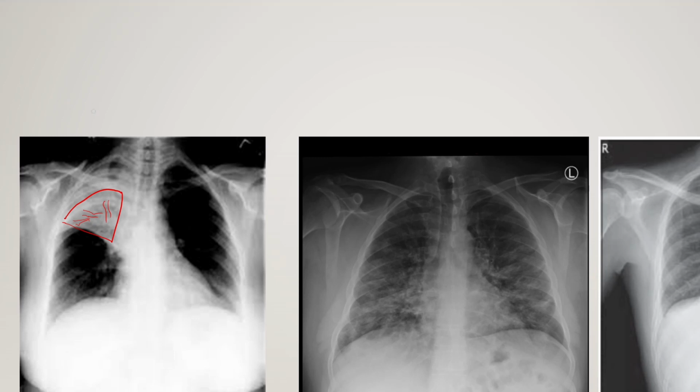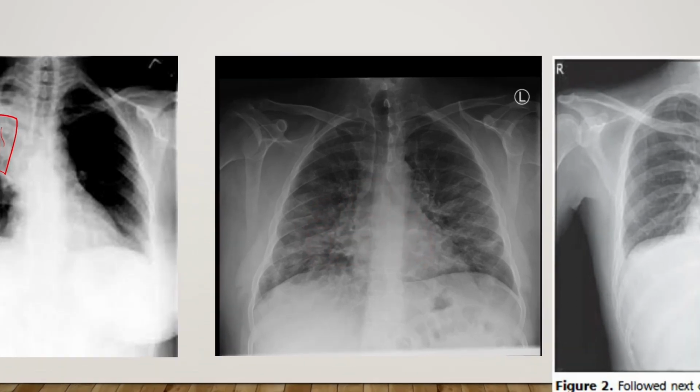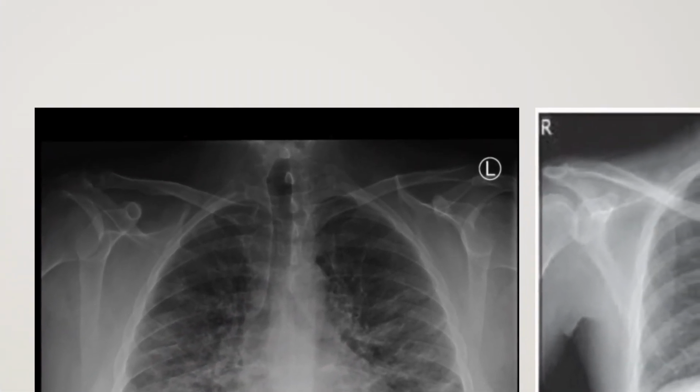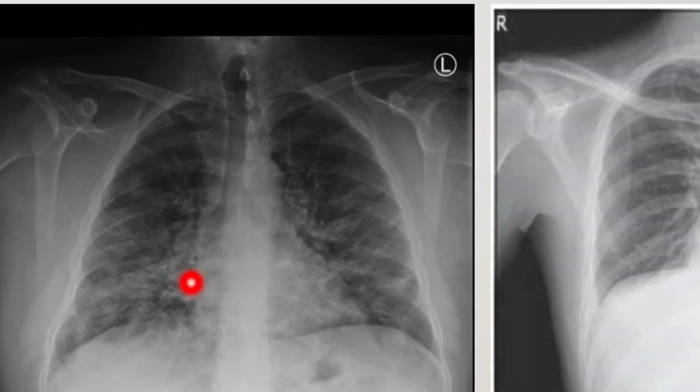Can I get my... Alright, it's not letting me. Alright, whatever. So just think of this as lobar pneumonia. Here I've shown you bronchopneumonia. Okay? This is what I meant by patchy opacities. And like I said, it's more prevalent in the lower lobes.